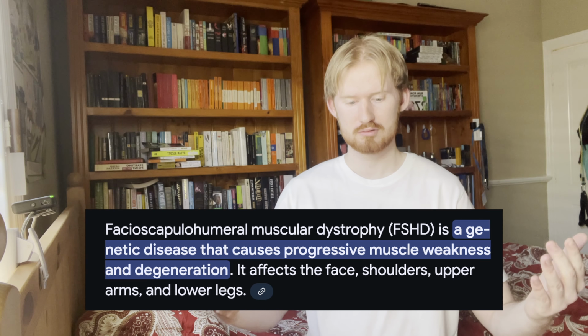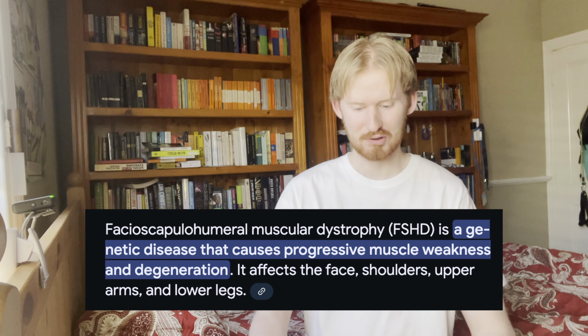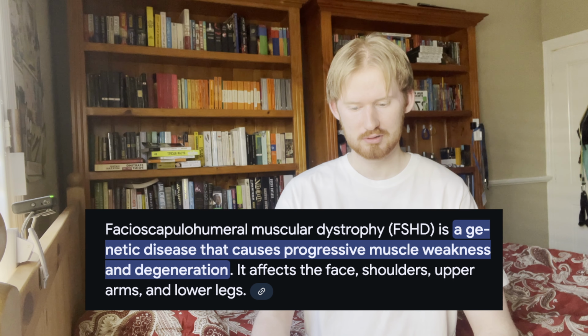I've got my laptop with me here, and I'm just gonna go over a scan that I got done a few months ago. The scan was a sort of unique MRI, and it took that info and made a 3D model of me from the inside, so it shows all my muscles and stuff, which is pretty cool. It's a little bit weird, but hopefully you'll find it interesting. I have muscular dystrophy, so this is useful to me. So yeah, let's take a look inside me, I guess.